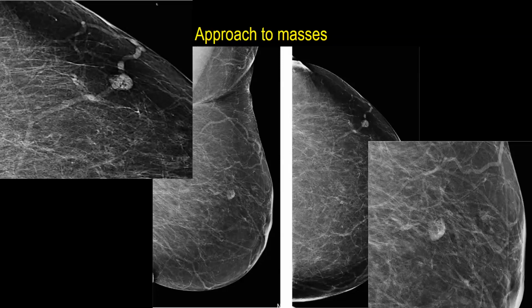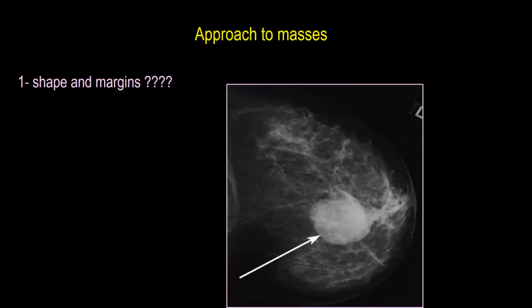It has a center, right? In the center. Low density. Low density. And look, this is a CC view, and this is the MLO. Where is the mass? Center. Radiolucent. Yes, it is in the upper outer, and it has a radiolucent center and vessels coming nearby. Lymph node. Lymph nodes. Oval. It is oval, circumscribed, small. This is typical, very typical. This is mixed density. Mixed density intramammary.